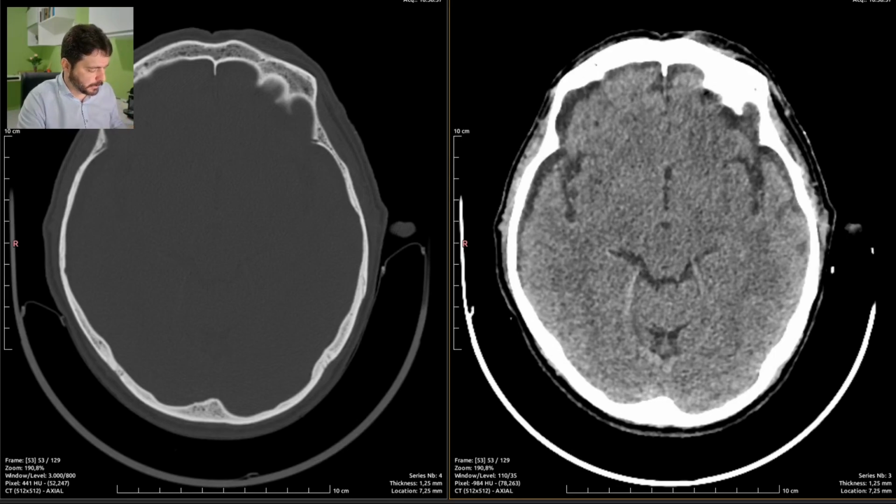that already says this patient has atherosclerotic calcifications of the intracranial arterial vessels. I'm going to describe those tiny spots of microvascular disease of the white matter.